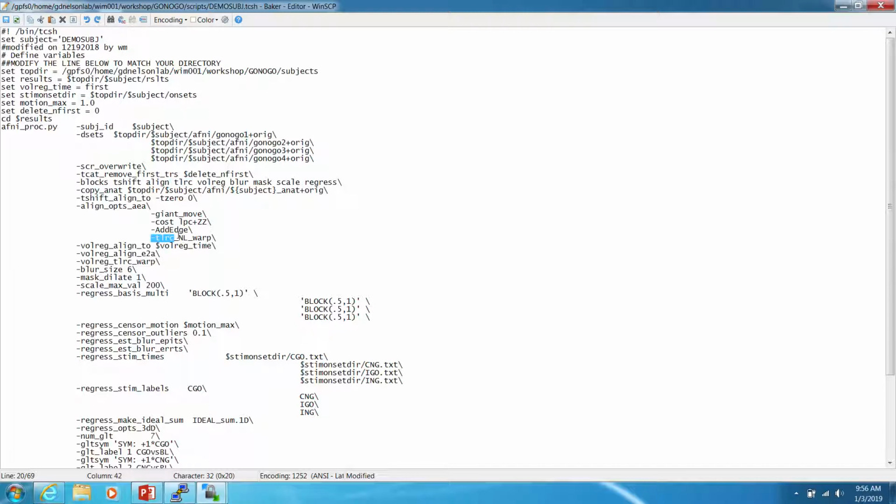So this option here, ordinarily by default, it'll scale the original anatomical image to better fit the template. It'll move it spatially in space. It'll also rotate or pitch or yaw the image so that it rotates around. Those are called affine transformations. They change the characteristics of the image, but they don't change the relationship between each voxel in the image.